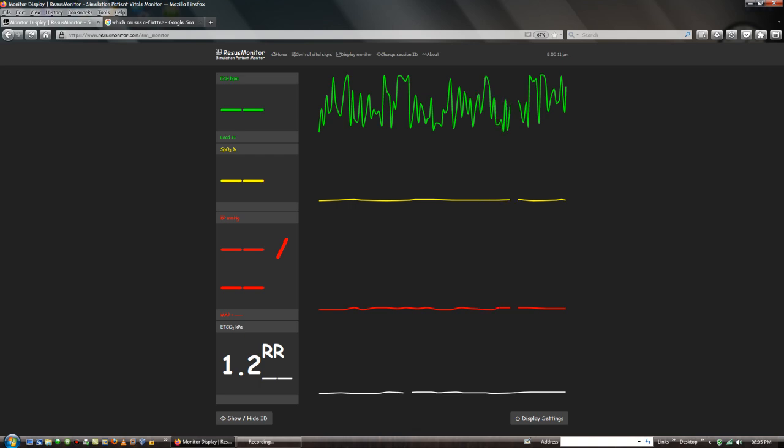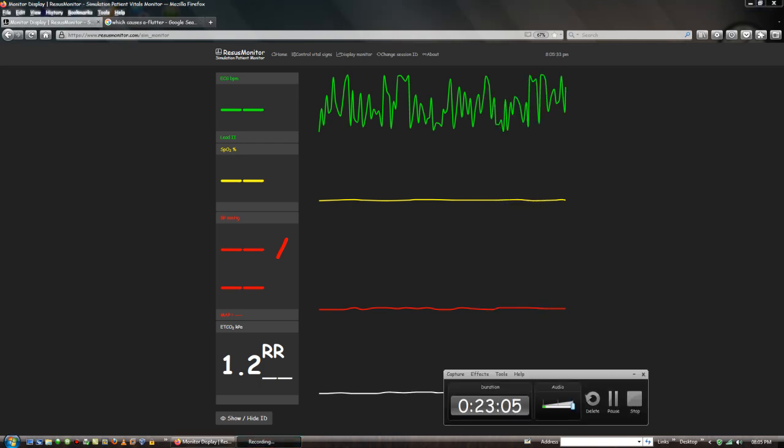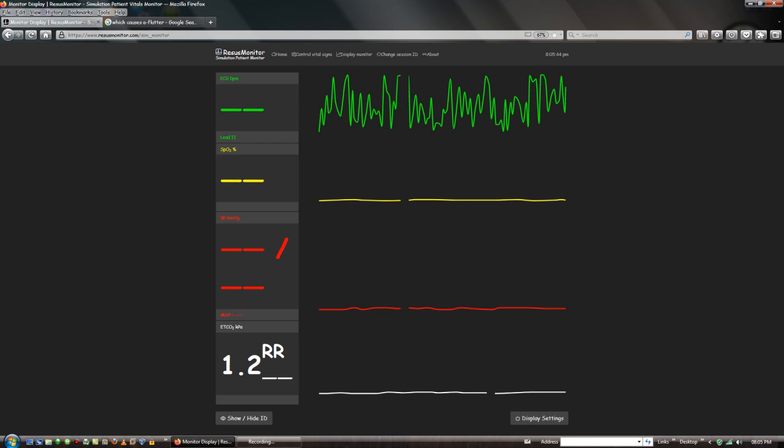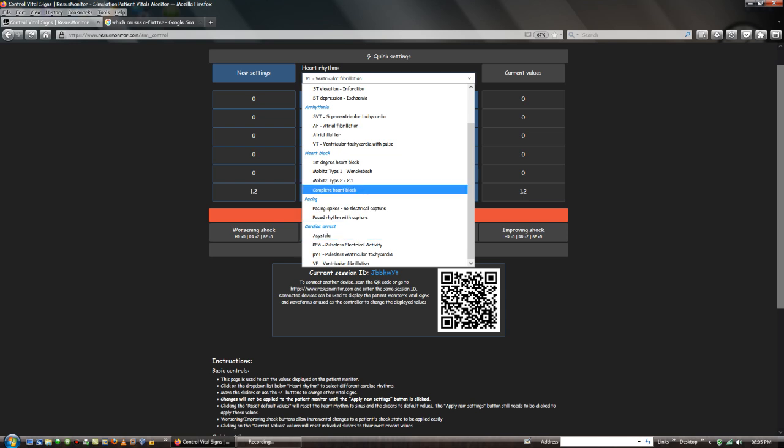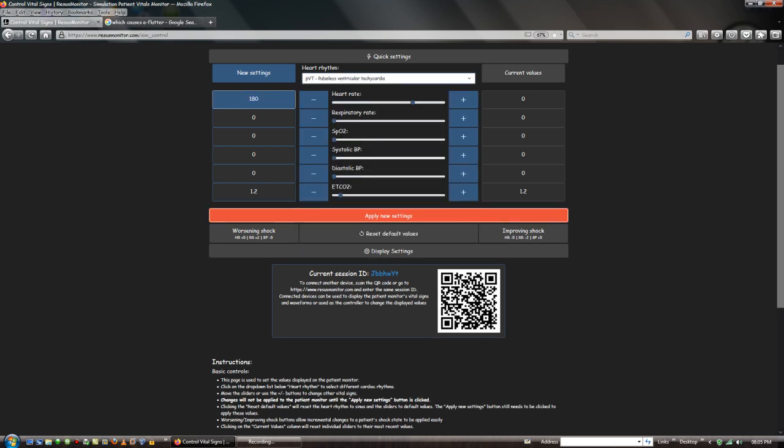of defibrillator. Then, when they select that, they charge the EKG rhythm. Once that is done, they will analyze. Then they can shock the rhythm. Then the patient is back to normal sinus rhythm. Next, we'll change the EKG rhythm, and I will select pulseless ventricular tachycardia.